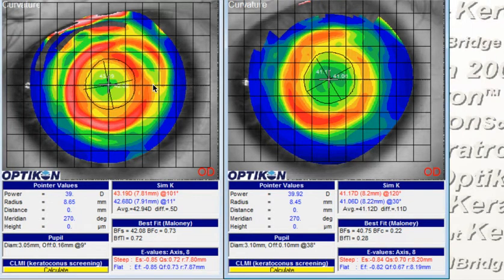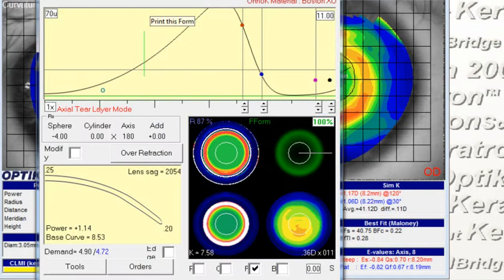In this orthokeratology case, we have a patient who's complaining of glare when driving at nighttime, and also some haziness to vision when walking indoors. We look at a couple of post-op topographies. The lens has been reordered with a larger optic zone, and that did help to enlarge the treatment zone a little bit. So there's a proposed third lens with an even larger optic zone, and I'll bring that up.